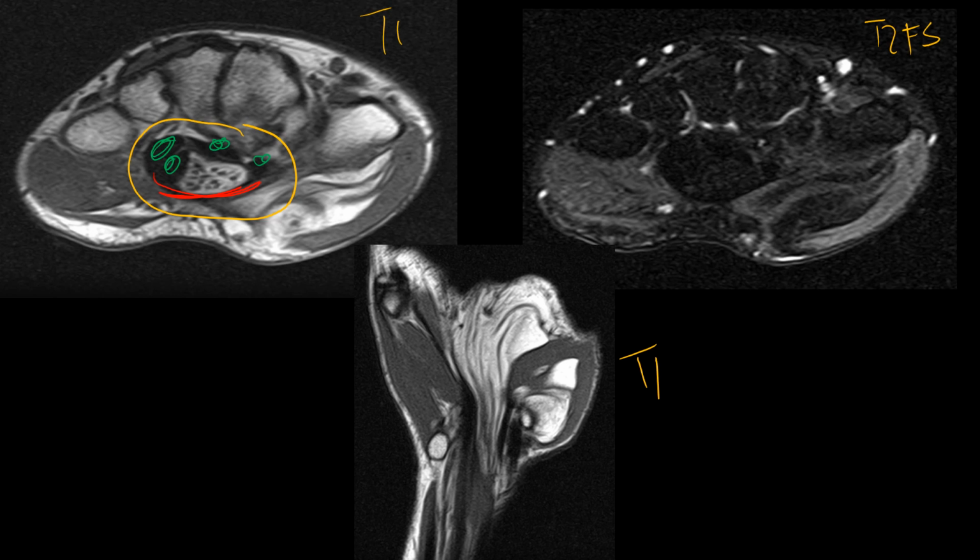And what we see is this big high T1 signal intensity lesion within the carpal tunnel that has some little dots in the middle. They're called the cable sign, like little cables. Because it's really high on T1 signal intensity, but then on the T2 fat suppressed image it's really dark, we know it's fat, macroscopic fat. And this is the location of the median nerve. So you got a lot of information here. You have a fatty lesion that lives within the median nerve or at the expected location of the median nerve.